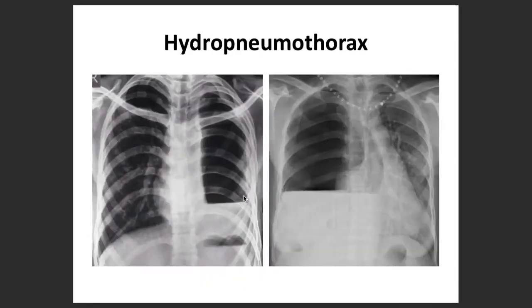Okay, now hydropneumothorax. Come on, try to understand the English. Hydropneumothorax. Any chylous fluid or any kind of fluid in a pleural cavity. Okay, good, good. But how do you see fluid and air? Exactly. So you are able to see not just air, but also fluid as well.